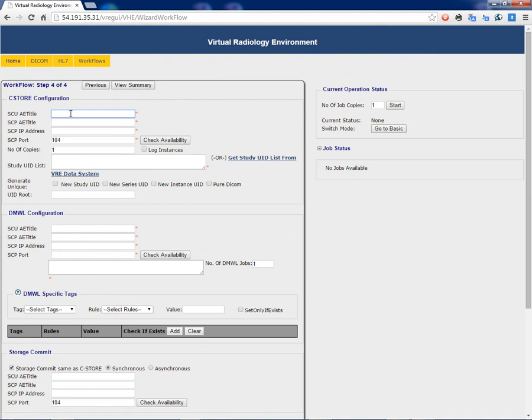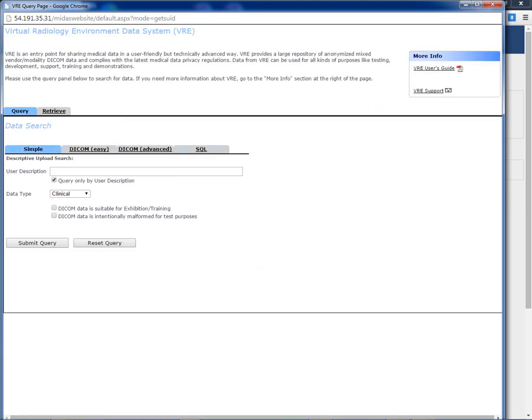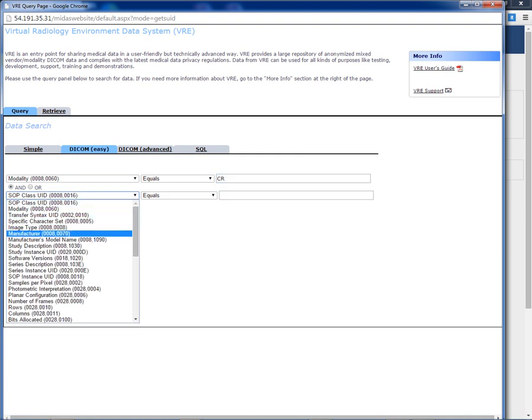We'll set up our AE title, set up the target AE title, leave the port. We'll leave it at 1 copy. And now we'll go to the VRE data system to retrieve the study that we'd like to use for this test. We'll use a CR from a well-known manufacturer.